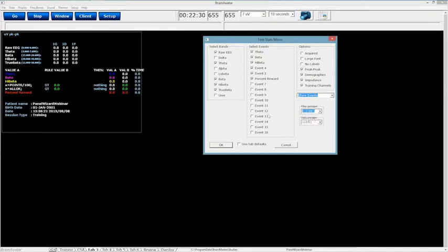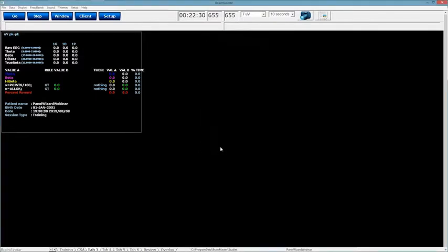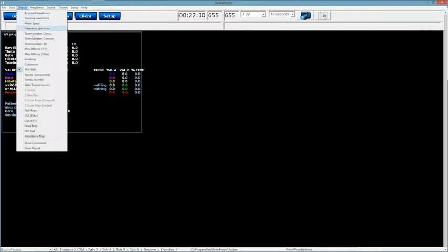You also have one further step to change your filter precision as far as how it's displayed. So basically what I'm saying is, when it comes down to it, you have a lot of control over what you're looking at, how you're looking at it, and you can even change it from panel to panel, which gives you really good flexibility. So I'm going to bring out one more display, and then we're going to start playing around with some different things that go along with it.